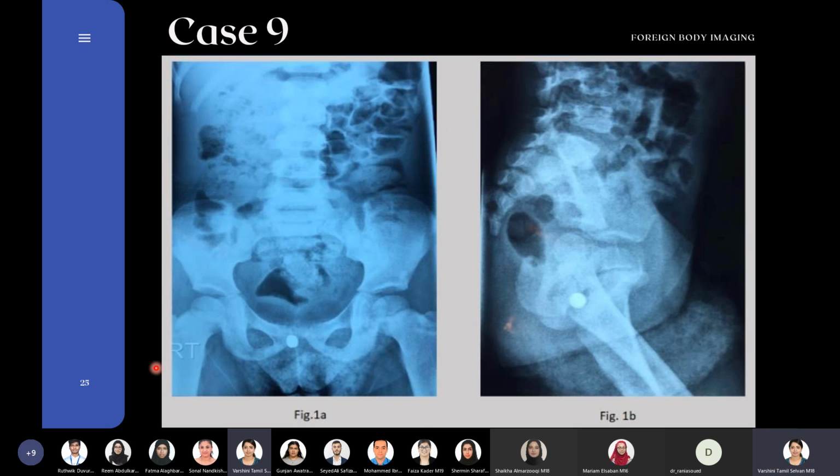Absolutely correct. This is the X-ray. Which part of the human body is this X-ray focusing on? Abdomen region, and there's another region which the lateral view is showing. So the frontal view is showing abdomen, the abdominal region. Yes, brilliant job, brilliant job. It's the abdominal pelvic region in the lateral view.